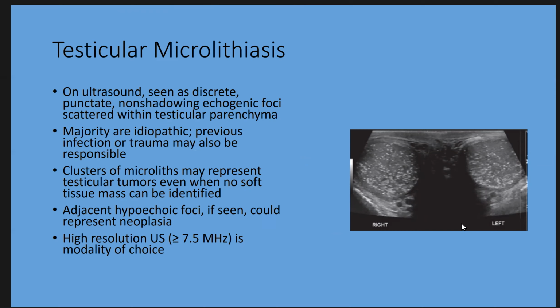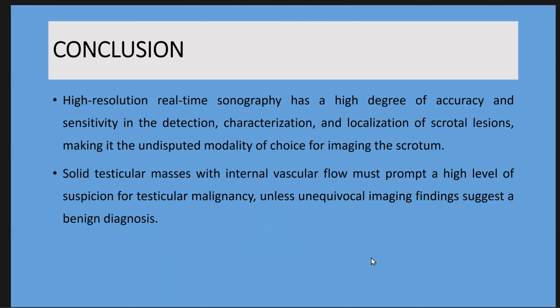Germ cell tumor is reported to increase in these patients in absence of mass lesion. In conclusion, high resolution real-time ultrasonography has a high degree of accuracy and sensitivity in the detection, characterization and localization of scrotal lesions, making it the undisputed modality of choice for imaging of the scrotum.